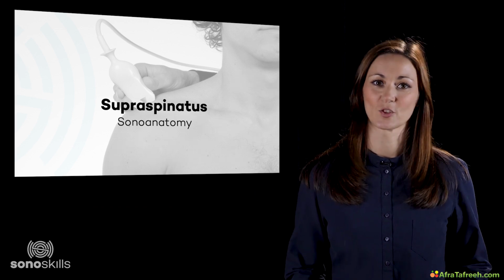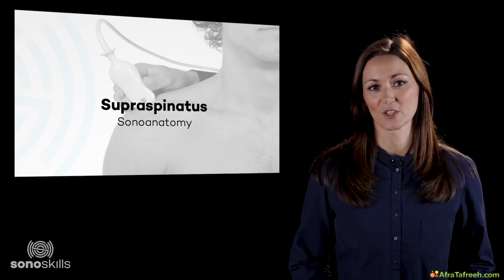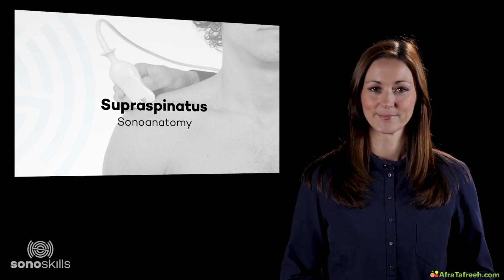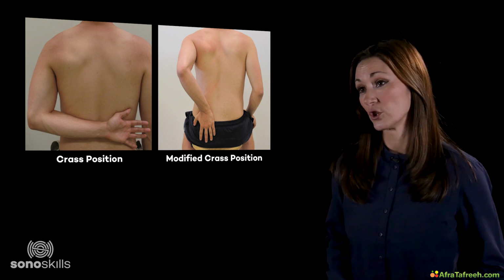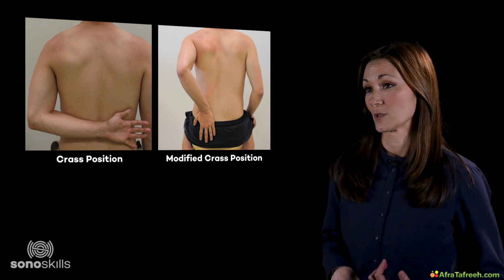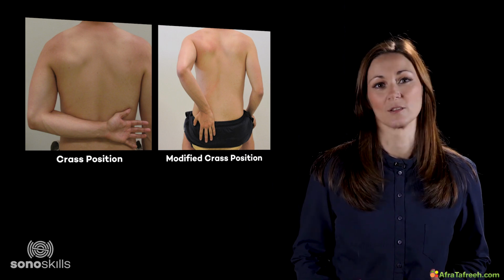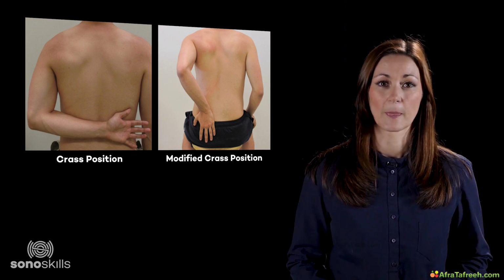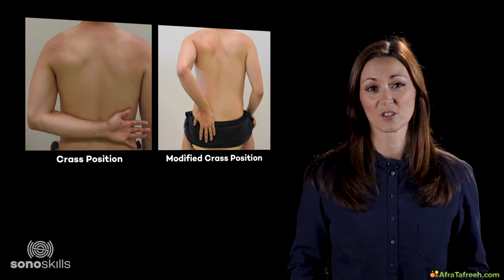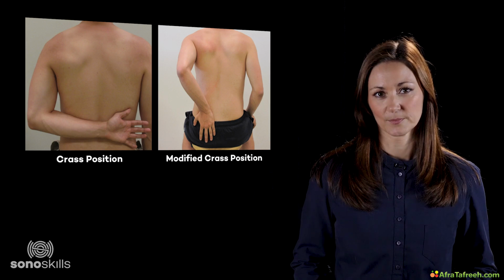The purpose of this presentation is to explain the supraspinatus anatomy and to understand the correlation to musculoskeletal ultrasound. There are two ways of scanning the supraspinatus, longitudinally and in the transverse plane. The first is placing the patient in CRASS position, the second in modified CRASS position. The modified CRASS position is sometimes also referred to as the Middleton position.